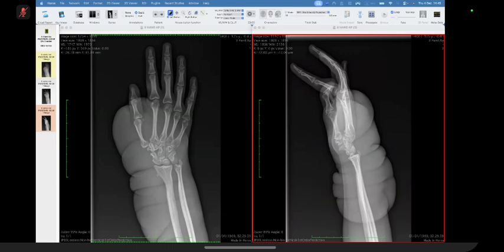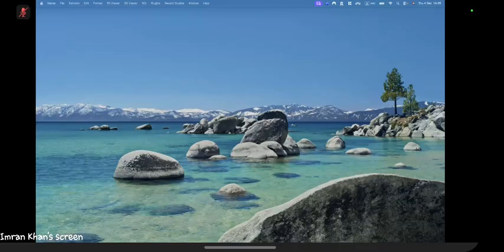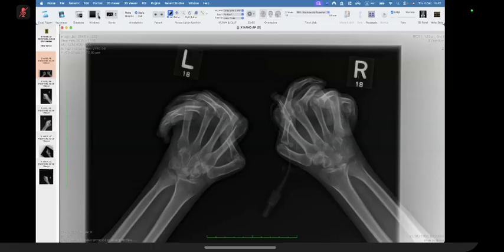I'm going to give you another case. We've done this case, we've done this case. Okay, and let's go for this one. Tell me what you think of this X-ray. I don't have the age available. There are multiple X-rays. I'm going to show you this frontal view first. If you want, I can show you the others. Tell me what you think. Sorry for that.